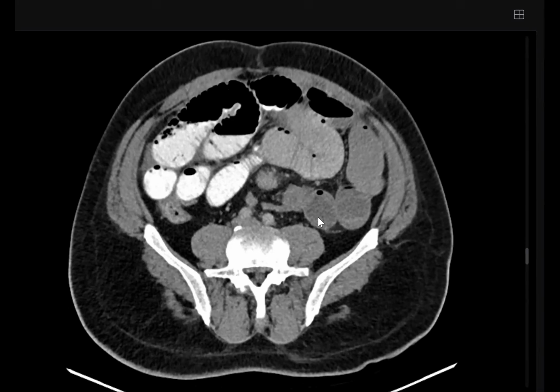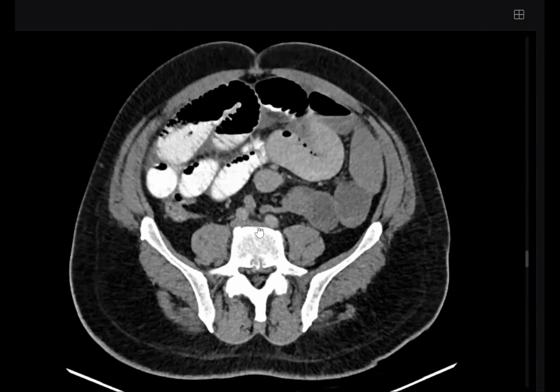So, what is your final diagnosis and next step of management? Sir, my most likely diagnosis is that of the carcinoid tumor, which is causing the desmoplastic reaction with resultant small bowel obstruction, no perforation at the time of the study, and no metastatic focus noted at the point of the study. So I would like to convey my findings to the referral. I would like to refer the patient for DOTA-TATE PET CT, and then refer the patient to neuroendocrine tumor MDT for further evaluation and management.